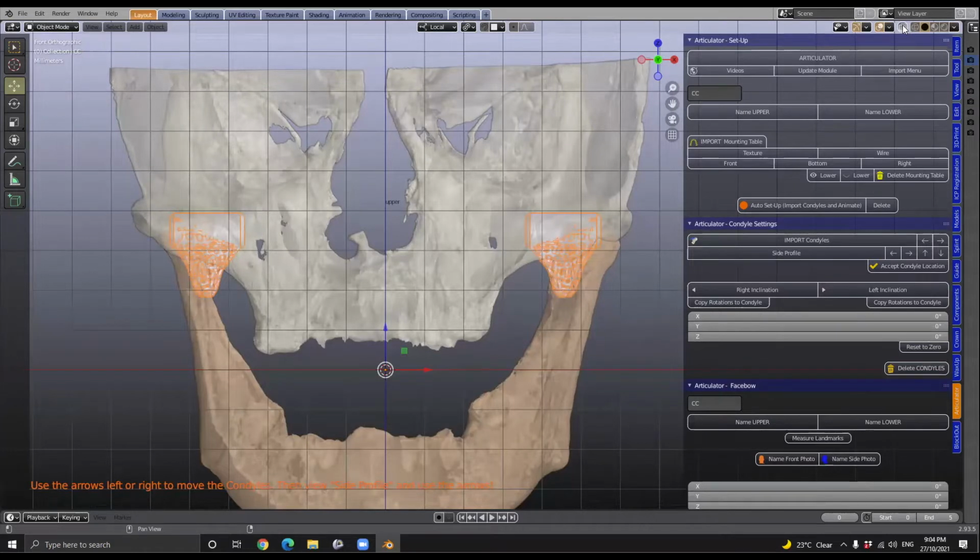Now, these are set 110 millimeters apart. If you measure from center to center, that's 110 millimeters, and that equates to most dental articulators. Already we can spot that in this specific case there's an error, because the centers of the condyles are slightly further apart. Maybe when they did that, they used an average, okay?